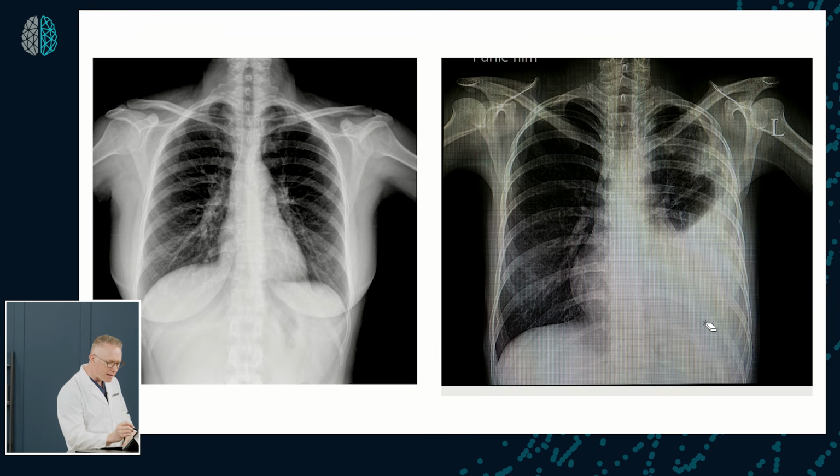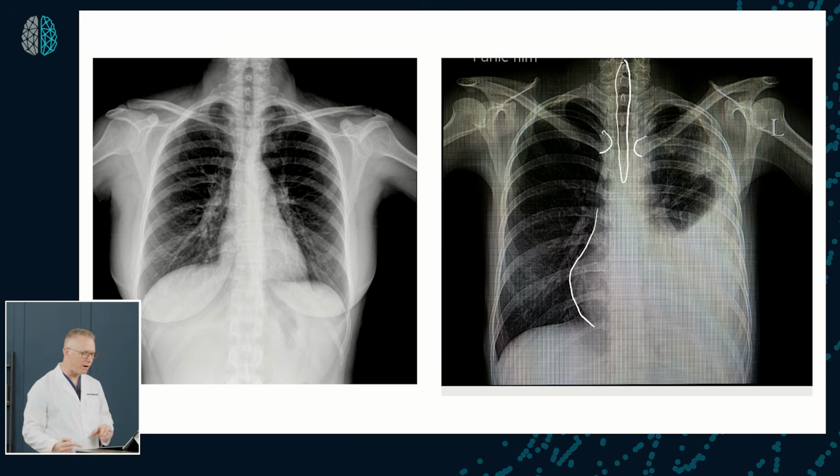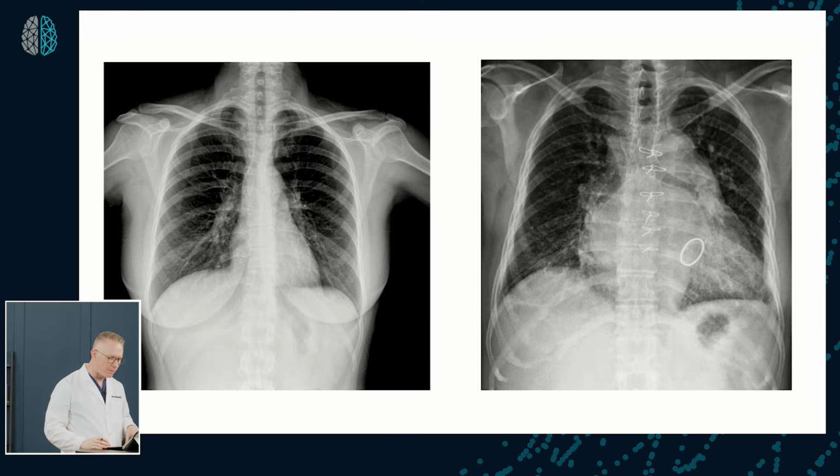You also see that this does look like a fairly good midline. Clavicular heads seem to be equal, and there's some bowing out here. What's going on there? So again, with this patient, something is pushing on them, pushing the heart over, right? Fluid, a mass, or something else pushing on that. Also could be causing changes in the intracardiac pressures that are bowing out that right atrium and some of the portion of the right ventricle.